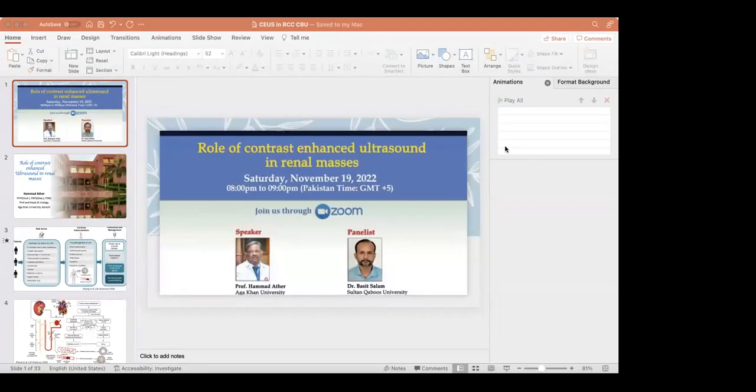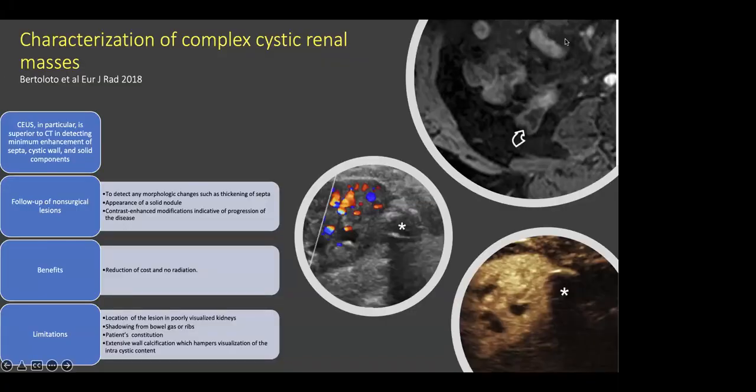So sometimes it is challenging to see behind these areas, and we then need to look at the other available imaging, like the MRI in this case, and compare these things together.